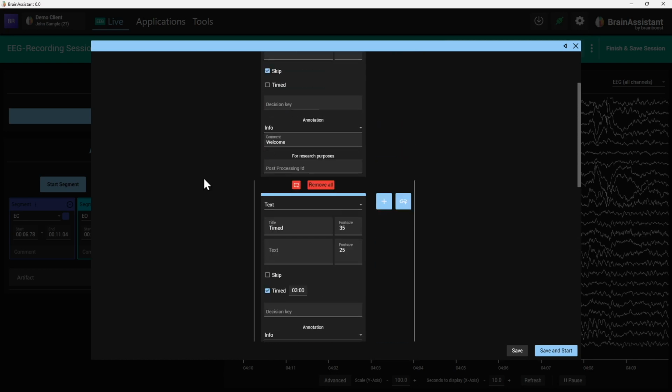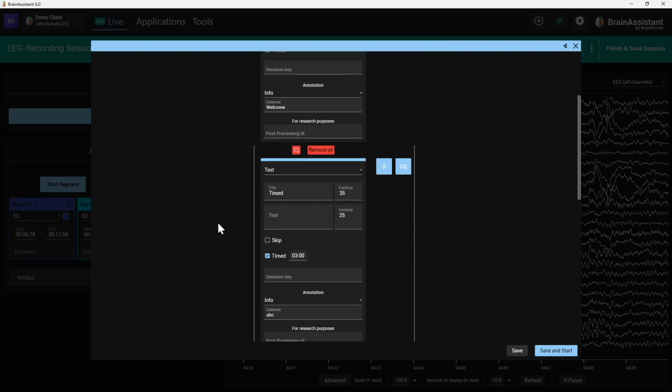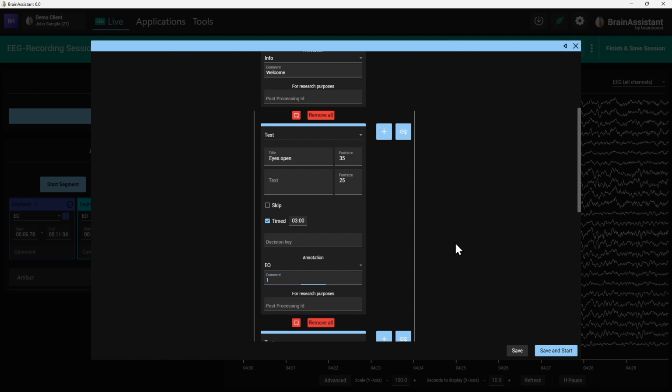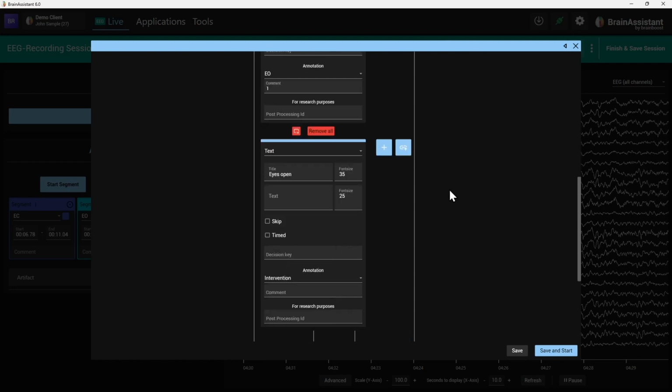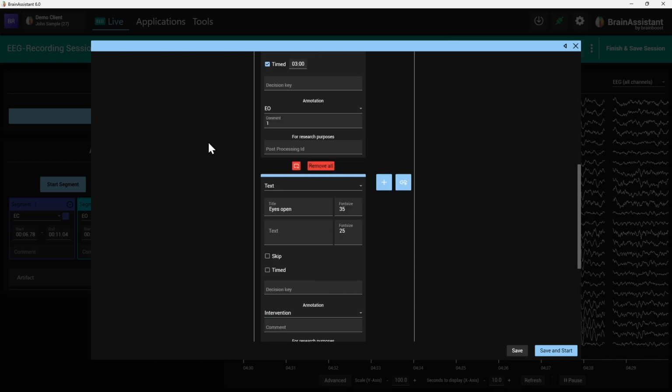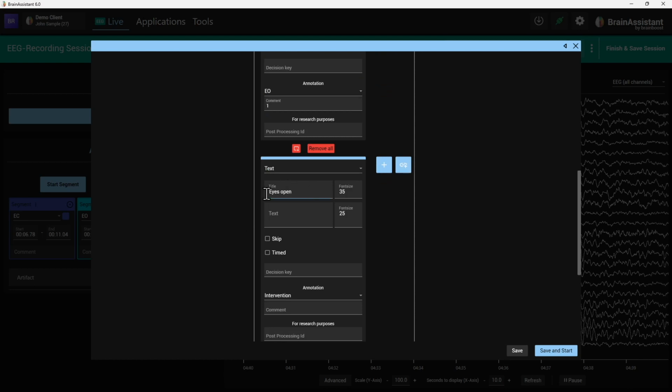But hey, this is timed. I have a welcome dialog. So here, of course, we can just say eyes open. Maybe you want to use a few words like please keep your eyes open. And then it's not an info anymore. It's an eyes open. And when we afterwards later might want to do another eyes open to have an orientation, it can be the first eyes open segment. So nice. We don't need a text element anymore because of course we could after eyes open say, thank you, let's continue with the next step. And then it could be a skip one because if you're ready to go to the next one, okay.